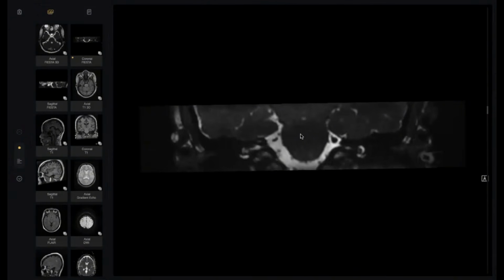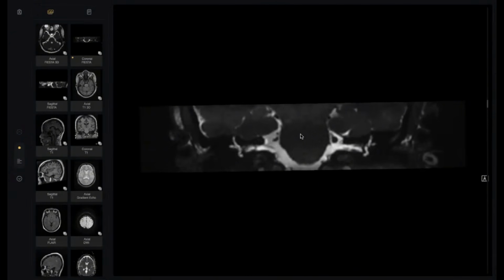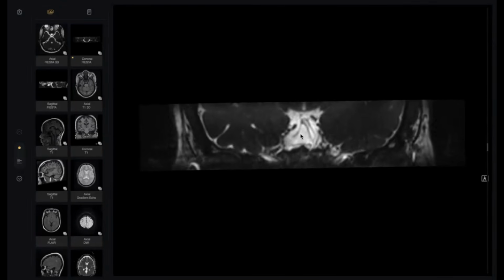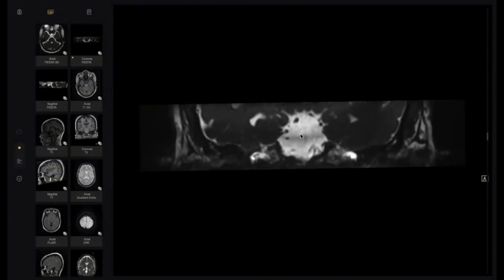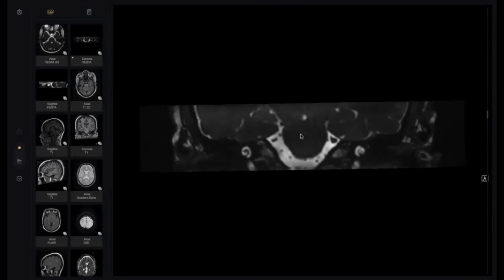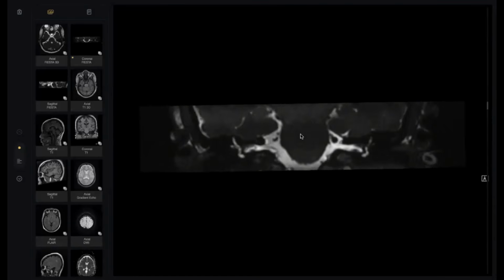Nothing is apparent. That's why I asked for the T2 and FLAIR, because the lesion may be apparent on them. I also checked for any abnormal vascular loop related to the trigeminal nerve. There is this vascular loop here. I would like to trace it. If it touches the trigeminal nerve, it may be the cause. It is closely related to it, and it is not found on the other side.